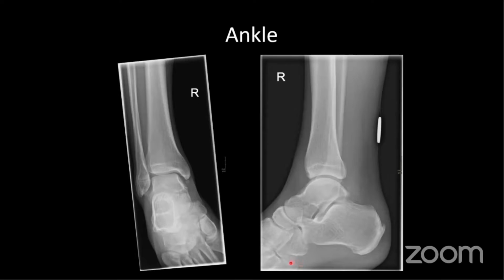Yeah, exactly. So this is the base of the fifth metatarsal. And this is a common place for fractures.